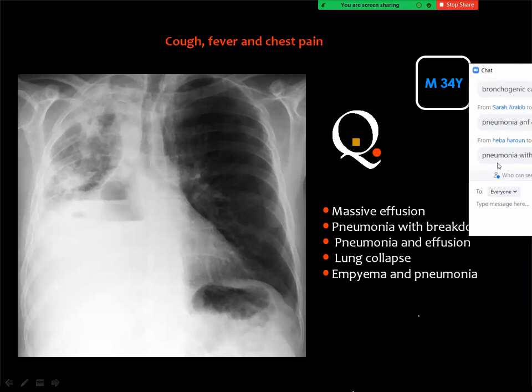Yes, and the answer is pneumonia and effusion, okay?